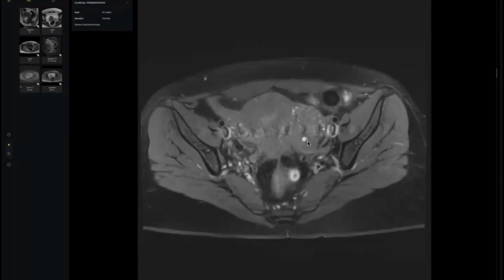There is an enhancing area noted within the ovary. So what is it? What's your diagnosis? It is in a focal area. I would like to see whether it is present on the T1 weighted images. Roshni, one second. Take a deep breath, please. This is T1 fat set. And you asked for it yourself to confirm something. Is this confirming your diagnosis or not? Yes, it is confirming that it is endometrioma.